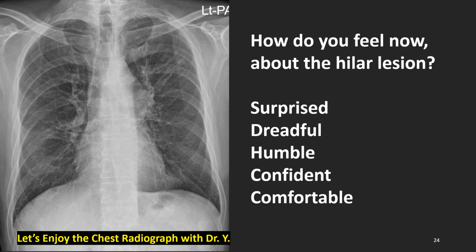How do you feel now when you see this image about hilar lesion? Surprised? Dreadful? Or a little bit humble? More confident about hilar pathology? More comfortable than before?